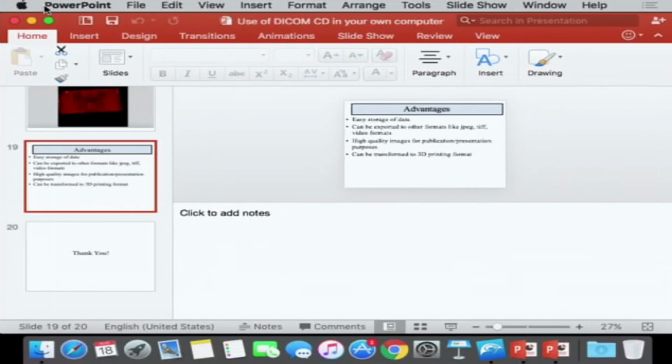So that is in a nutshell how you can process your 2D DICOM images for maximum use without using any other formats or technologies. Those have their own value, but this is just a handy tool. Before we get a 3D printing model in our hand, we can still do some juggling, and we can get the best information from whatever investigation we have done.